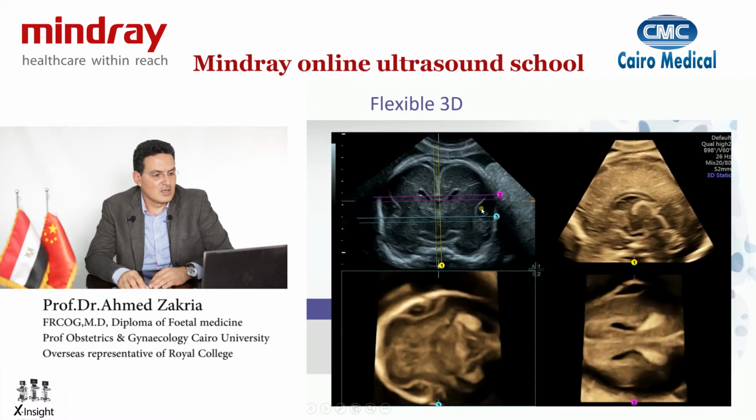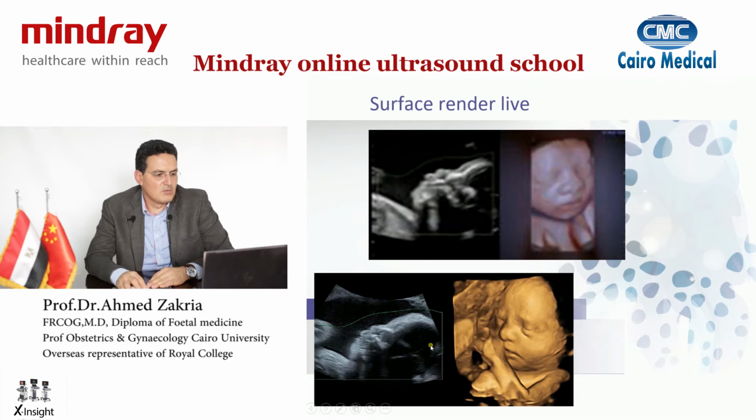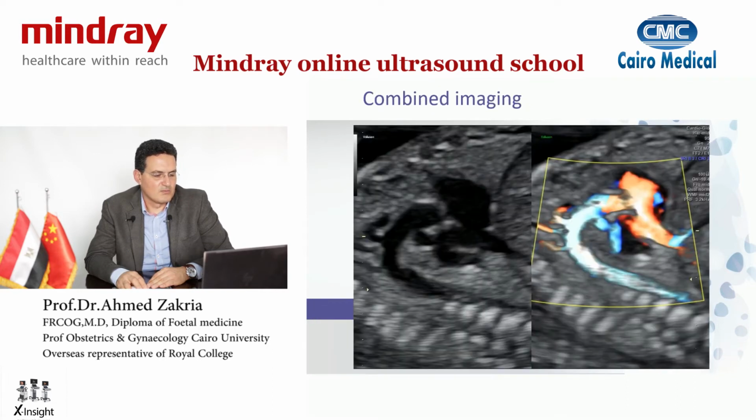For instance, here across the brain, if I cut this way, then I'm actually checking for the corpus callosum. If I cut that way, the corpus callosum is there. If I cut across the brainstem, then I'm actually seeing the thalami and the brainstem. So I can then move across the different areas of the volume and decide what I want to do, or move again and move across the different structures of the surface.